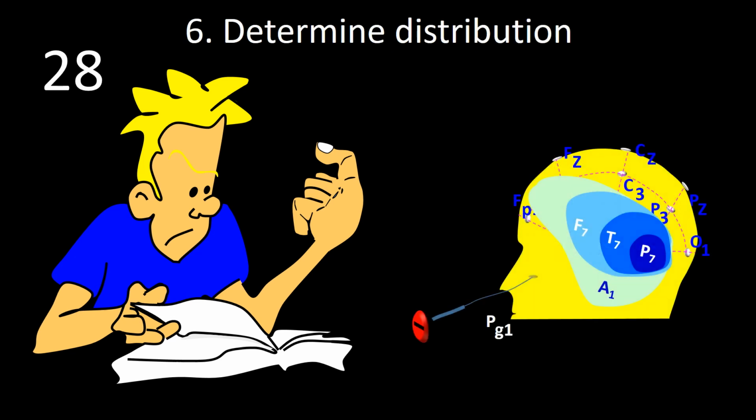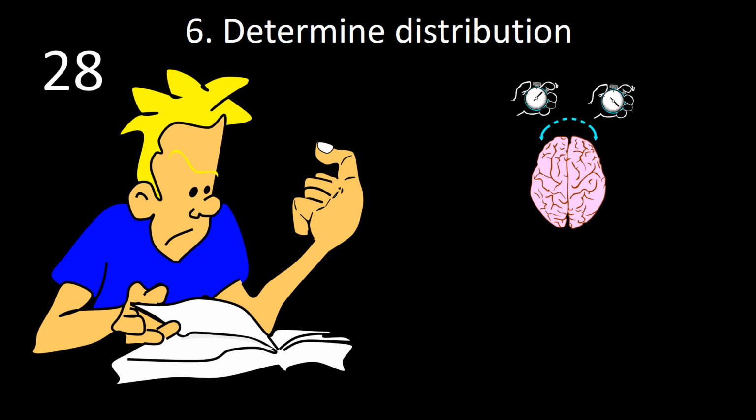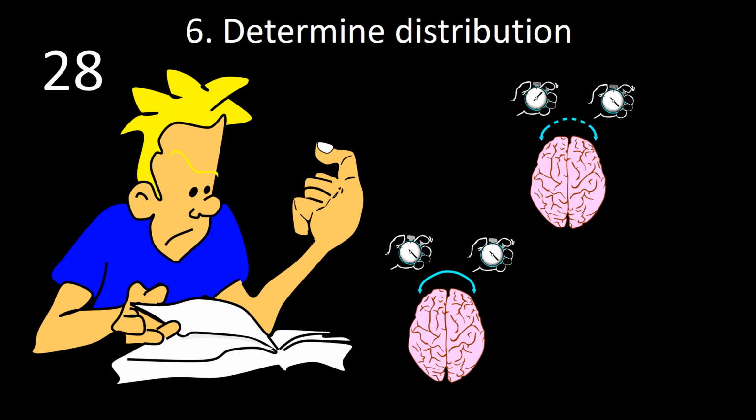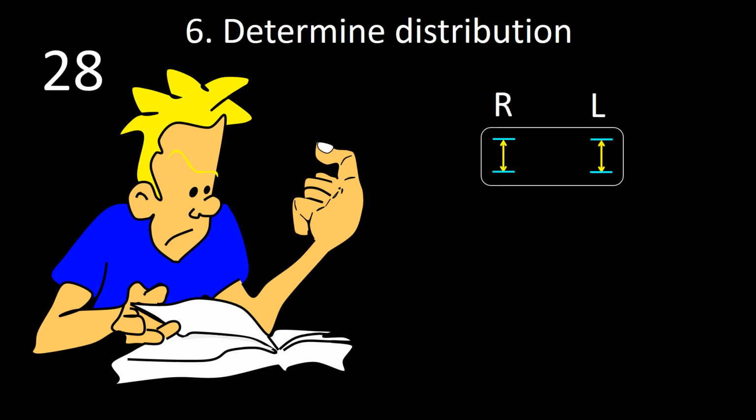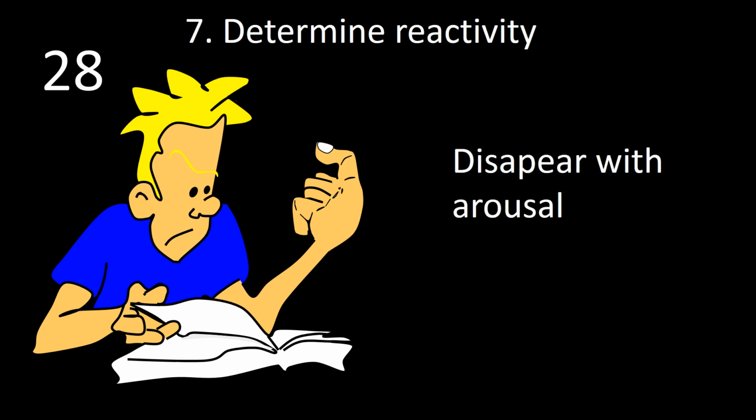They have the same field distribution as 14 and 6 positive burst, and most often are asynchronous, at times synchronous, and rarely unilateral. When they are bilateral, they are usually symmetrical or may show alternating asymmetry. They tend to disappear with arousal.